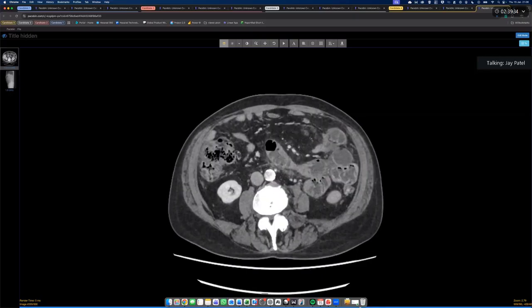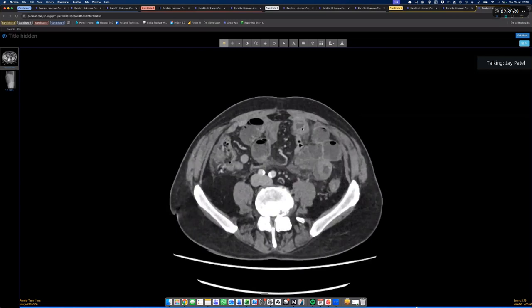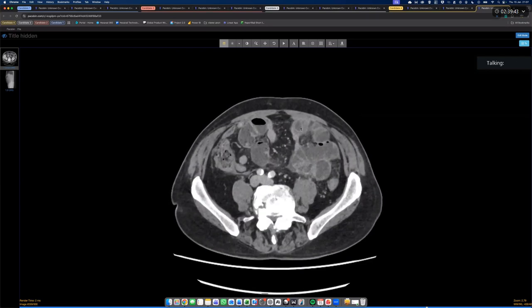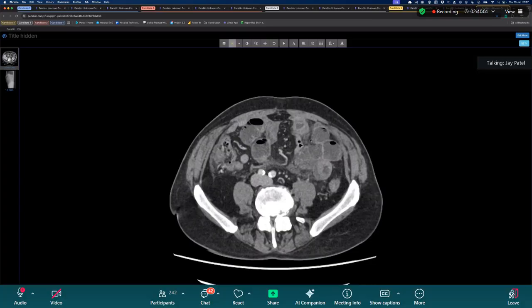This bowel here, I would refer to as compromised. It's thick-walled. It's edematous. So bowel is beautiful. Bowel's my favorite thing in GI because it's so predictable. But you've got a thin mucosal stripe, that enhancing bit. Everything low density and deep to the stripe is submucosa. And in this case, the submucosa is edematous, right? It's super low density and thick-walled. So this is submucosal edema.